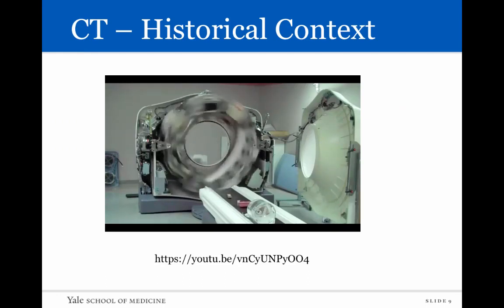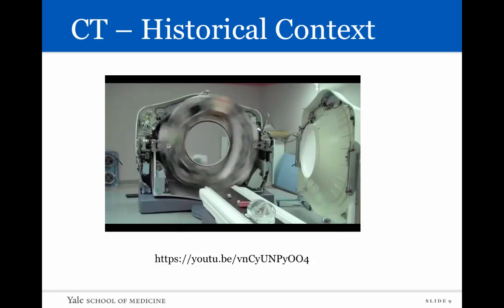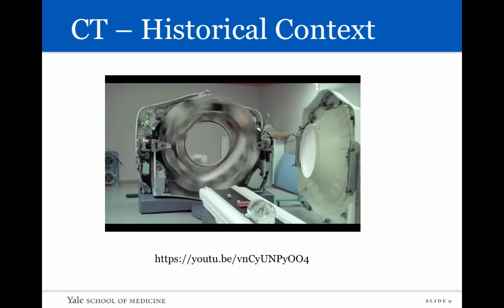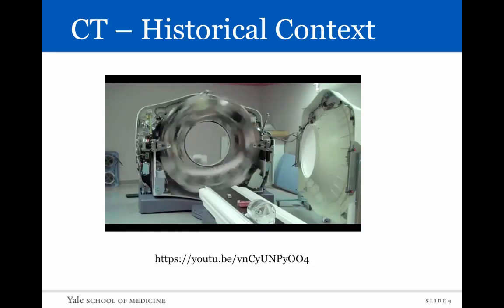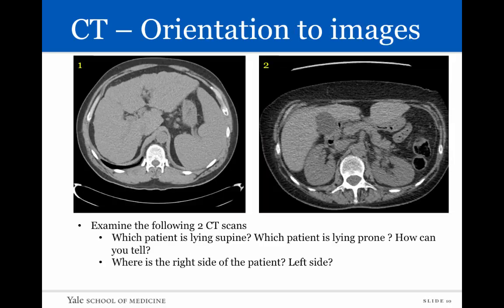Obviously, it's been unearthed a little bit to see the insides of it, and you can see it actually goes very, very quick, and so you can get CT imaging done from the head to the toe in 30 to 40 seconds. Initially, when this was first released, every image that they would take, every slice would be around 20 minutes each.